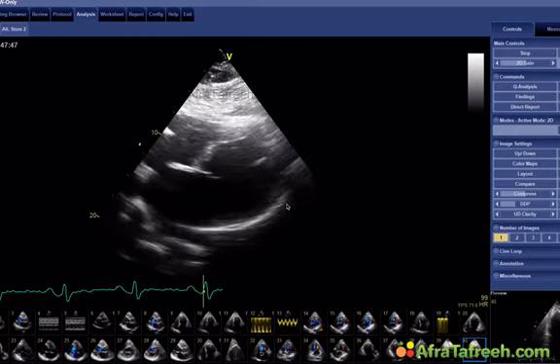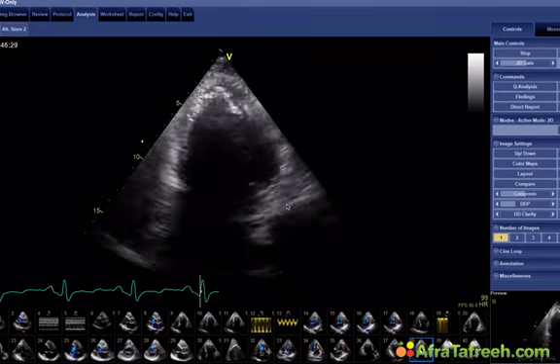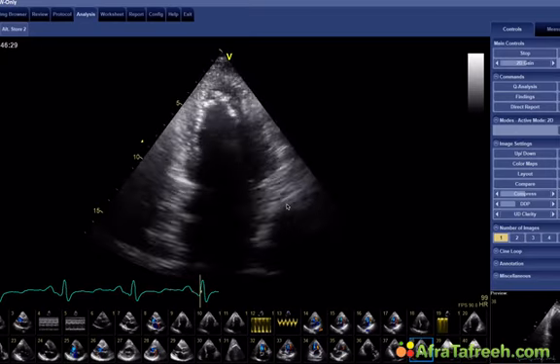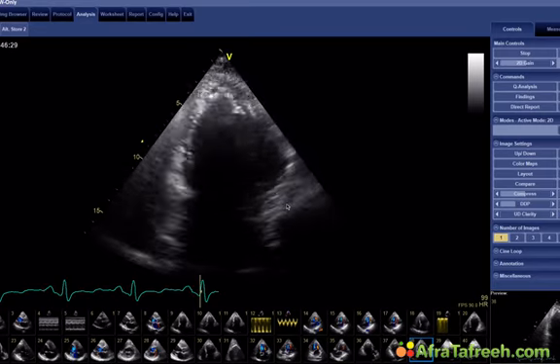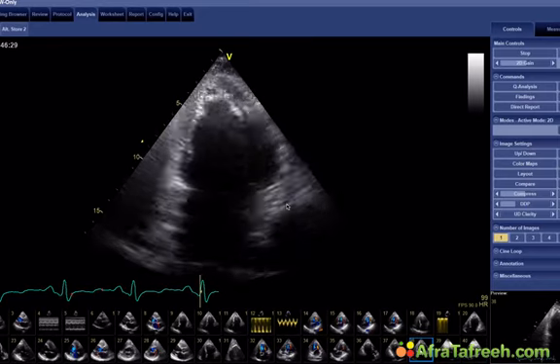Still, the question is what we should do next. And I don't know what your opinion on this case is, but if we just put all these things together, the patient has symptomatic mitral regurgitation and good left ventricular function. So in reality, this is an indication for cardiac surgery. And this is also what we proposed to the patient.